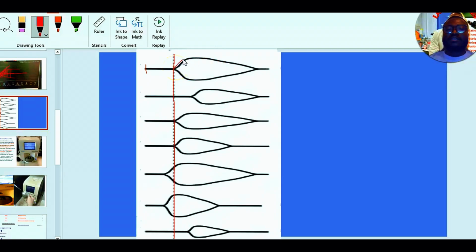So it gives a relatively wider angle on this side, which probably gives a normal alpha. The height here is fine, meaning the platelet level is okay. And then it took quite a longer time before the lysis ended, so the LY30 is relatively normal because it did not lyse the whole clot quickly. So we say this is a normal graph.